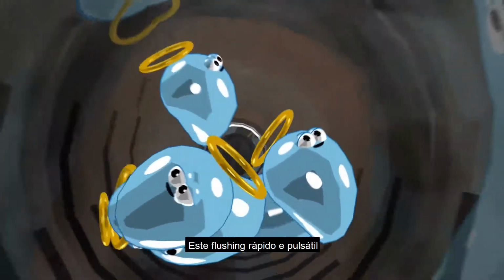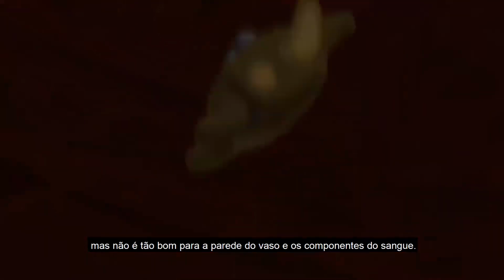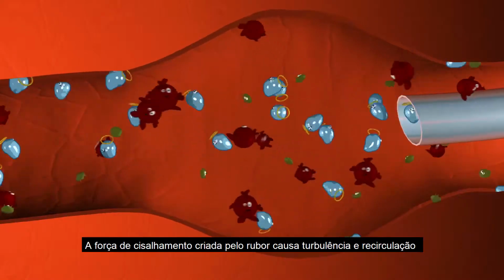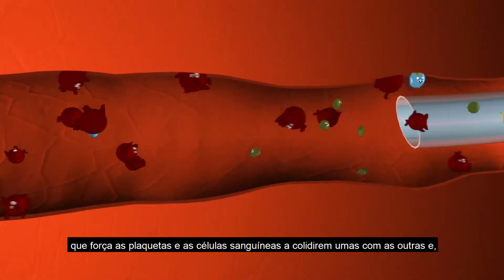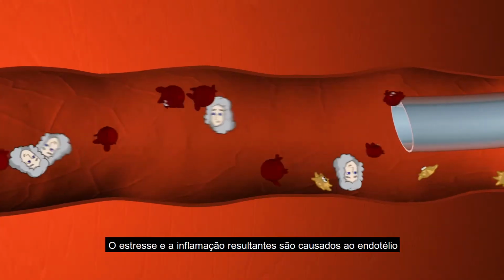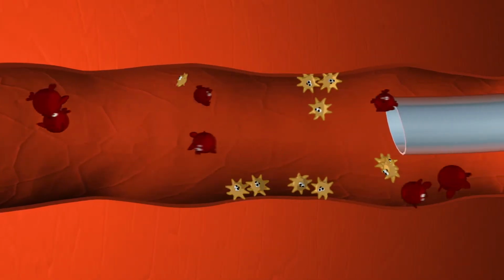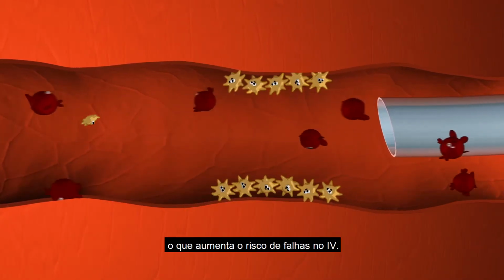This quick and pulsatile flush may be effective at rinsing the internal surface of the catheter, but it isn't so kind to the vessel wall and blood components. The shear force created by the flush causes turbulence and recirculation at the catheter tip that forces the platelets and blood cells to collide with each other, and in line with Newton's third law, every action has an equal and opposite reaction. The resulting stress and inflammation caused to the endothelium and the presence of the catheter further encourages coagulation and thrombus formation, which increases the risk of IV failure.